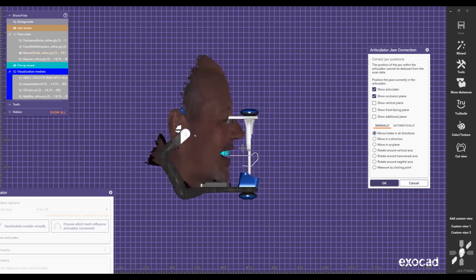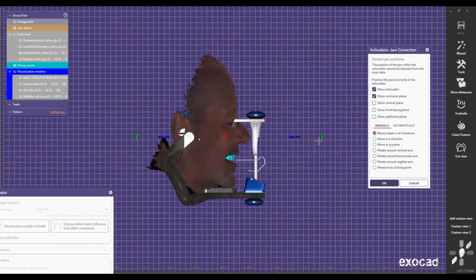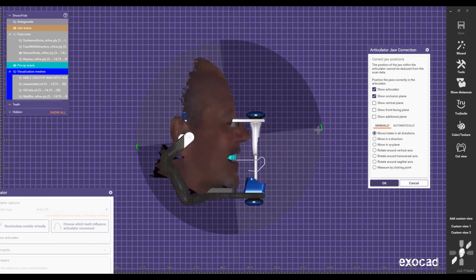And how do we find the natural head position of these patients, right? We don't have anything level to the floor. So we're able to find this position in Exocad with the face. Here, I'm trying to make sure that the patient's head is not facing down or facing up. I'm looking for a nice profile view. So I always tell my students, my attendees, always see that on the right side of your screen, there's a big mirror, and the patient is looking at that mirror so they put their head straight to it.